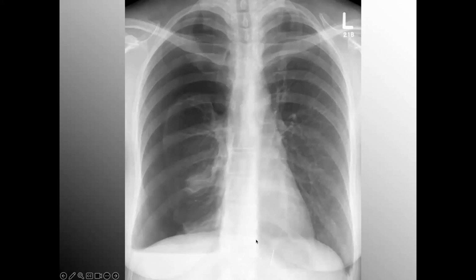I look at D, diaphragm. It looks like my left and my right. Okay, my right's slightly elevated, which is to be expected, but it's flattened. And my left is smooth, rounded, and domed and parachute-shaped like a diaphragm should be. So there's some reason that this is flattened.